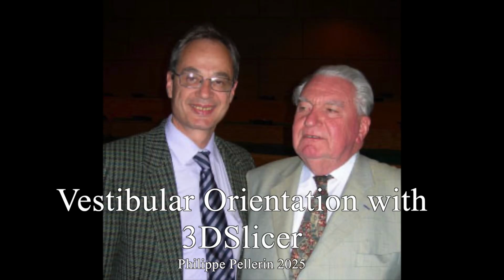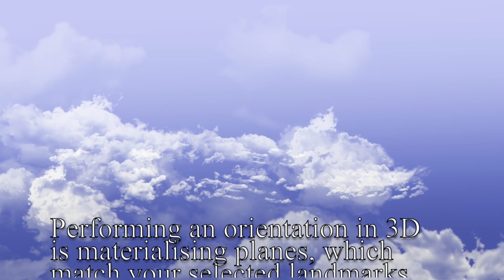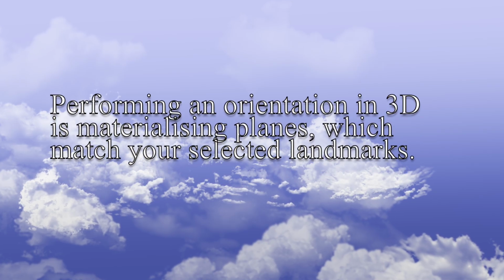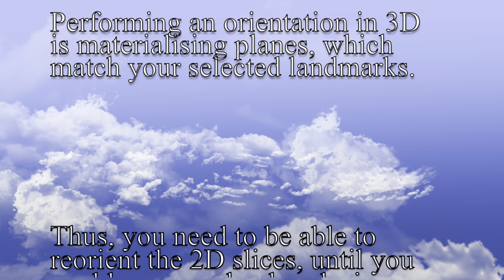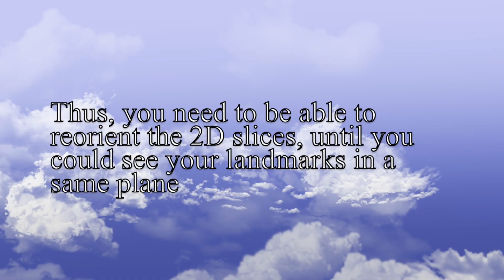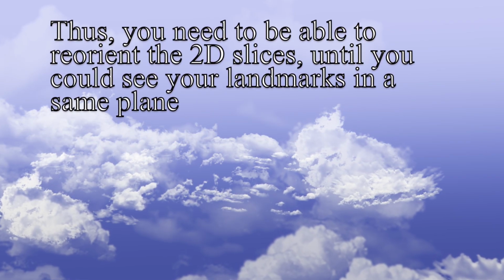I'll teach you how to perform vestibular orientation with 3D Slicer. Performing an orientation in 3D is materializing planes which match your selected landmarks. Thus, you need to be able to reorient the 2D slices until you can see your landmarks along in the same plane.